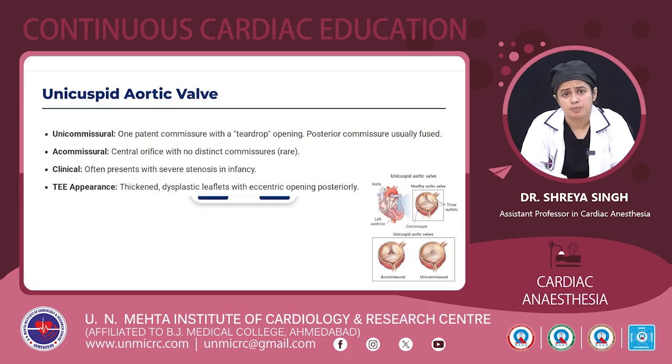Coming to the unicuspid aortic valve, it could be unicommissural or acommissural. Unicommissural usually has one patent commissure with a teardrop opening. The posterior commissure is usually fused. Acommissural, there is a central orifice with no distinct commissures, although this type is rare. These children often present with severe stenosis in infancy, and on TEE it appears as thickened dysplastic leaflets with eccentric opening posteriorly.